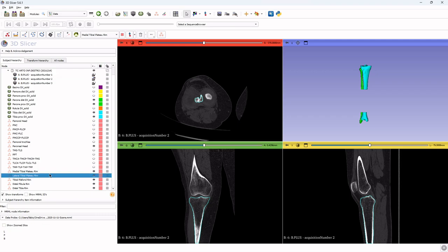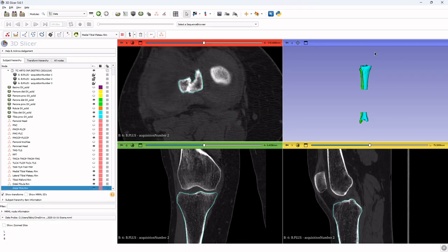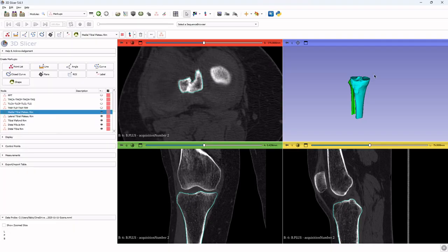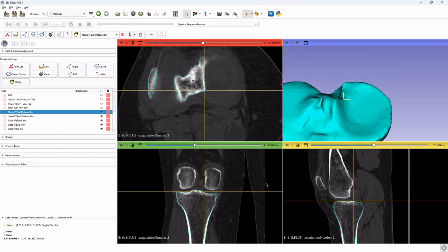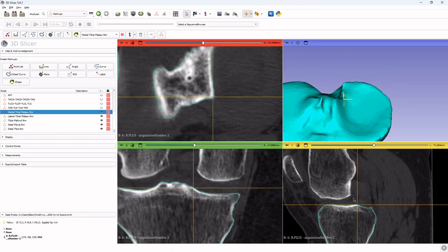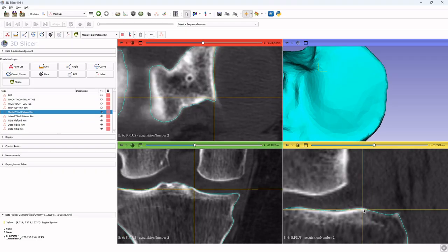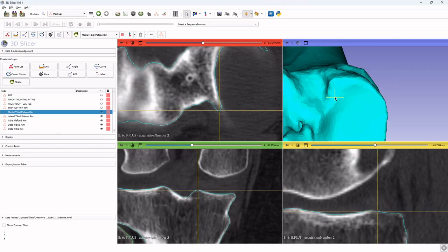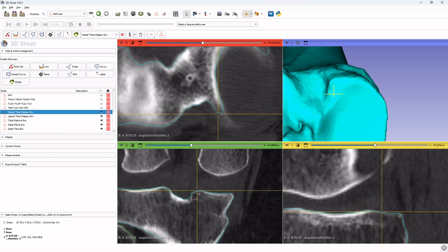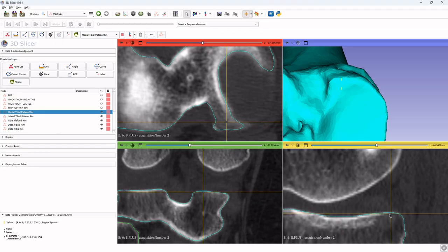Hi everyone, in this tutorial I will update the previously described method for assigning lower limb landmarks used to detect characteristic alignment angles. In particular, I revised the landmarks related to the tibial plateau and the tibial plafond. Instead of assigning 4 points for hemiplateau, we will annotate the rim, the margin of each hemiplateau, specifically in the region covered by cartilage, while avoiding the insertion areas of menisci and ligaments.